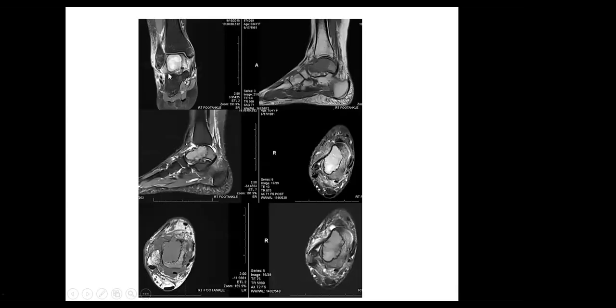On the MRI scan, which quite clearly demonstrates the tumor, I don't know if you identified that this is T1 fat sat post contrast showing enhancement. So this is not a cyst, because a cyst would be dark on this sequence and would just have peripheral enhancement.